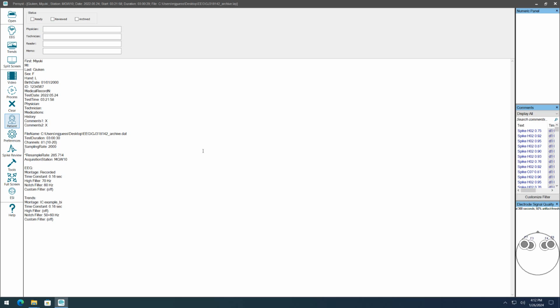And you can have mixed intracranial and scalp recordings. Now in this case it's not a mixed recording, and we're doing just offline exporting of the data and want to preserve that original sampling rate. So how do we do that?